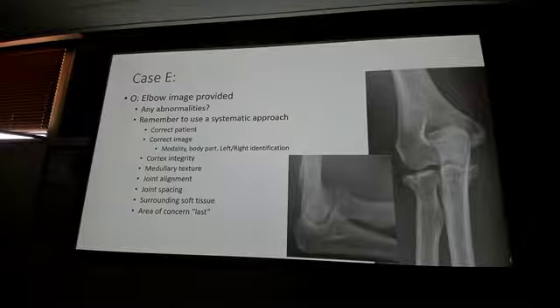All right. We all see the radial head fracture. How many of you tried to find a posterior fat pad sign afterwards? Now, a few did, right? So now before I pointed it out, do we need to look for the posterior fat pad sign on this x-ray? We do not, because the fracture is there, we see the fracture, we can diagnose the patient.